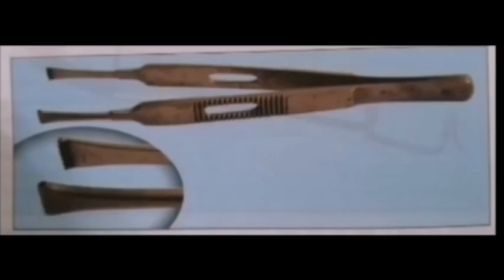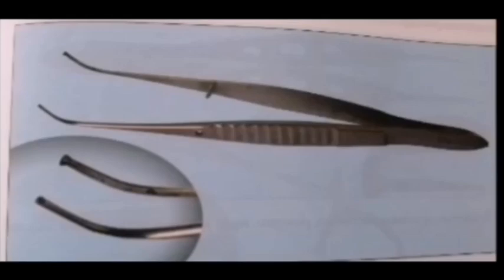The second forceps is fixation forceps. It has a narrow or wide jaw. It has teeth also. You can see in the magnified image. And what are the uses? It is used to fix the eyeball during the operation on the eyeball and to hold the eyeball during forced duction test, right? The third one is superior rectus holding forceps. It is also toothed forceps, right? You can see here. And it is used to hold the superior rectus muscle while passing a bridle suture under the superior rectus muscle.